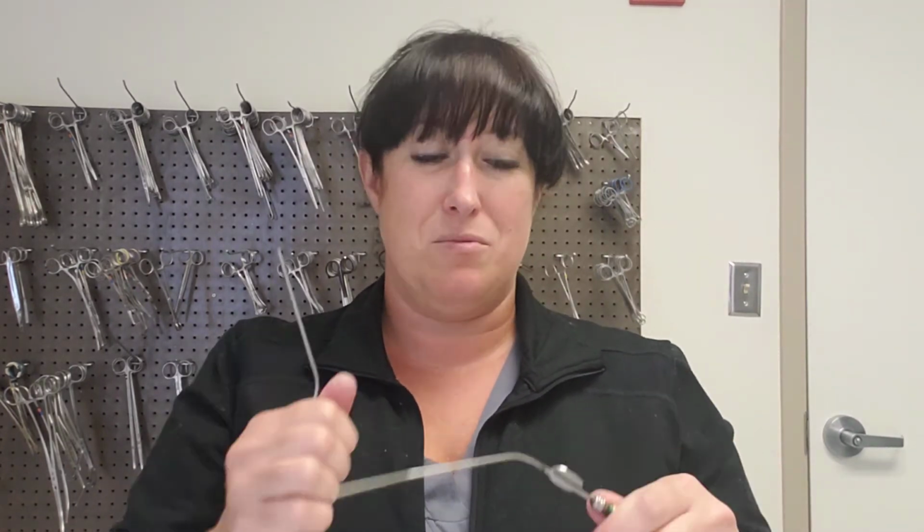I would start with the stylet because it really sucks when you're doing the syringe thing and you do it too hard because you're in a hurry and it just squirts everywhere. So you gotta be careful. So those are the Frasers, and those are the three different suction tips that we're going to talk about. So Fraser, Yankauer, Poole.